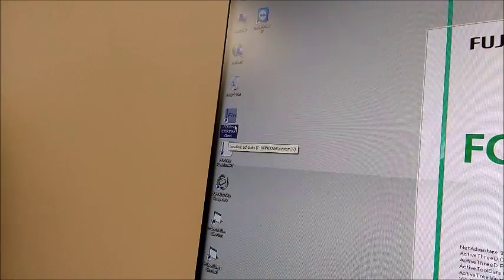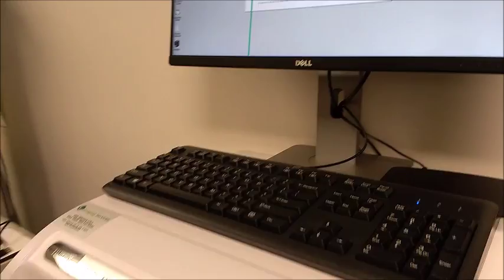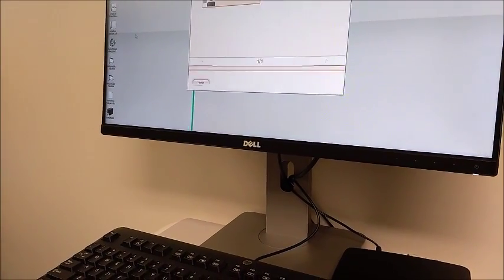Oh, client. Okay. But if you click on that one, it's just going to come up and say error. It doesn't work, so you know, you click on the next one. Okay. And I can take that icon off of there, but I like to leave them on in case at some point you do get a client. That way it's ready to go.